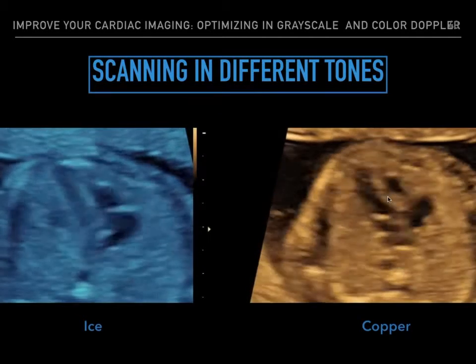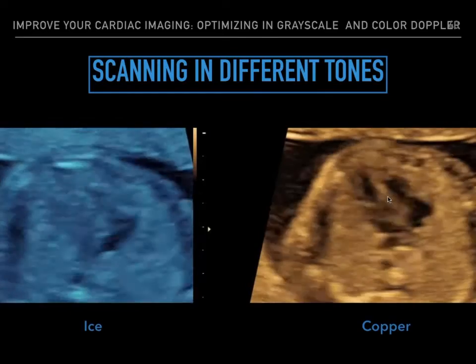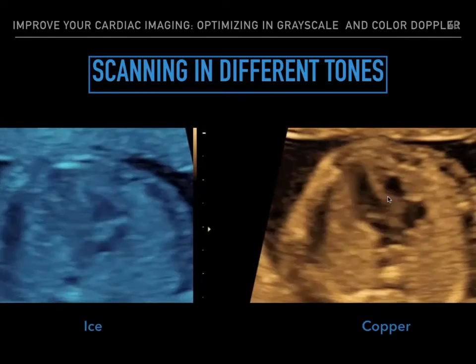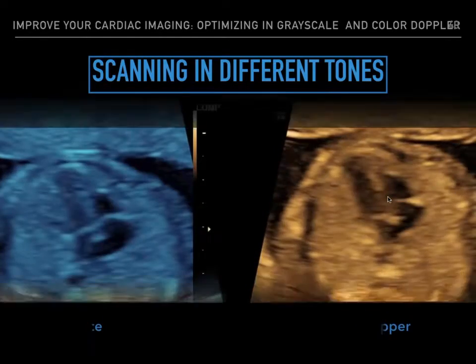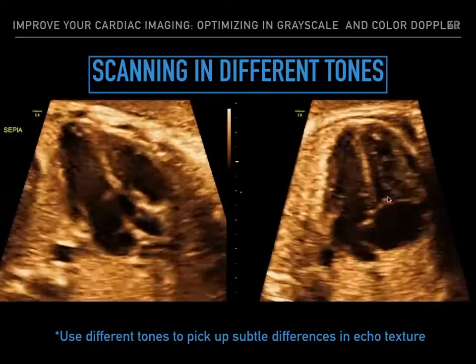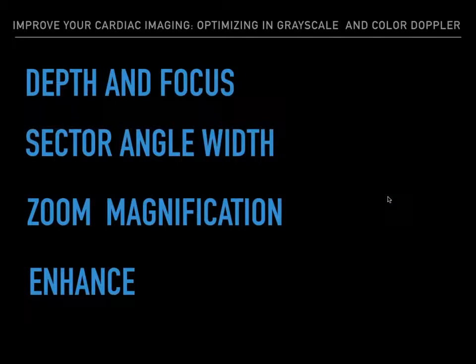Manufacturers have made available more color maps. Perhaps this may actually improve visualization or pattern recognition, as the human eye is able to distinguish image details in color rather than grayscale. What I've noticed is a lot of cardiologists usually like to look at the heart in sepia to pick up the subtle differences in echo texture that are difficult to see in grayscale. So why don't you go ahead and give it a try and you be the judge.